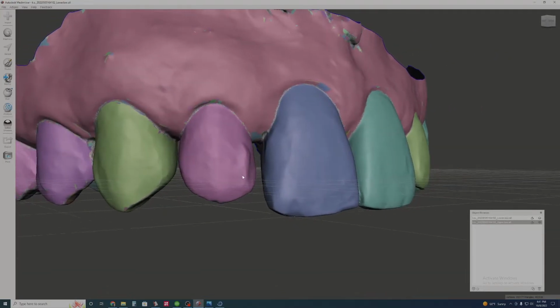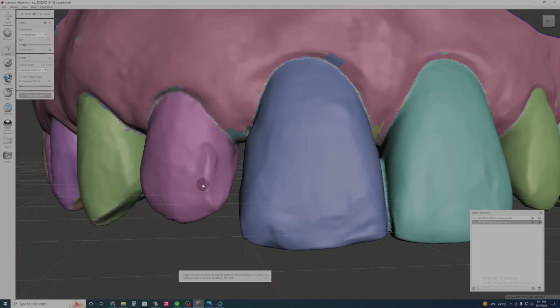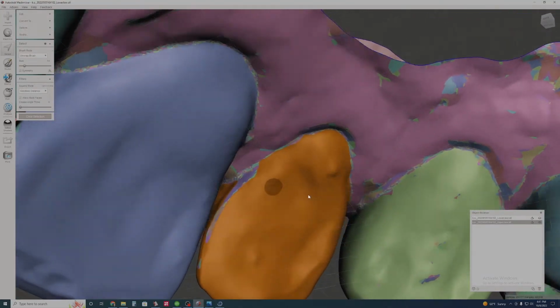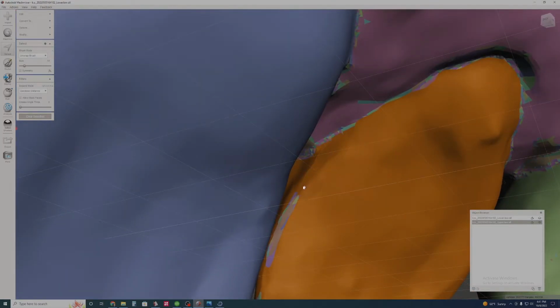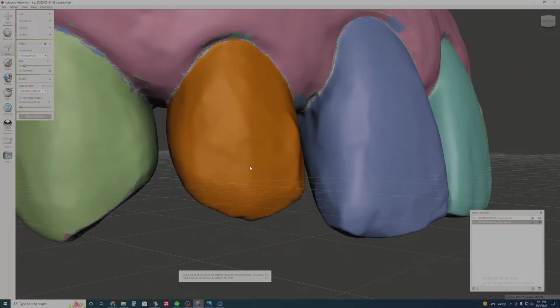So what I like to do, actually, you know what, in these cases it's a veneer. I've actually just prepared these as if they're going to be crowns. And I'm not doing crowns, so I actually have to make a small further modification to these. I want to deselect the areas I don't feel like I'm going to be prepping. Ooh, you know what? There are some unselected areas here. So I'm going to have to reset this face group. I'm going to hit the smooth tool again.